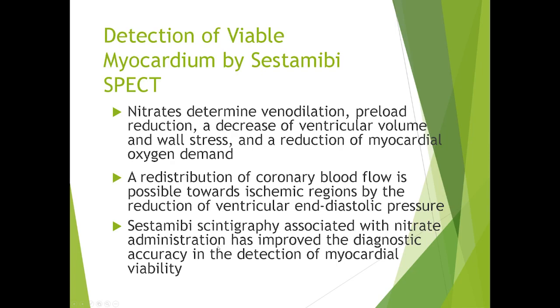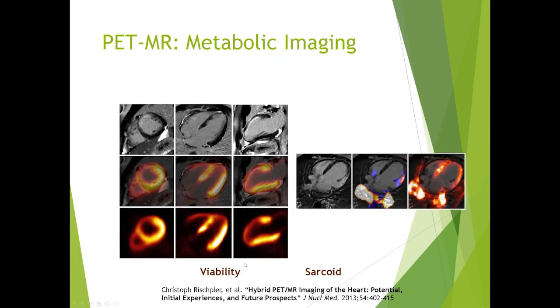So what we're looking at is areas of viability that would demonstrate uptake as a result of nitrate stimulation, which may be defects in the pre-nitrate images.